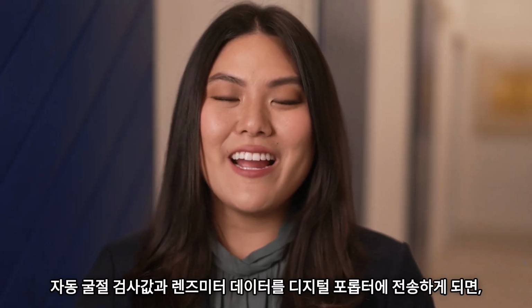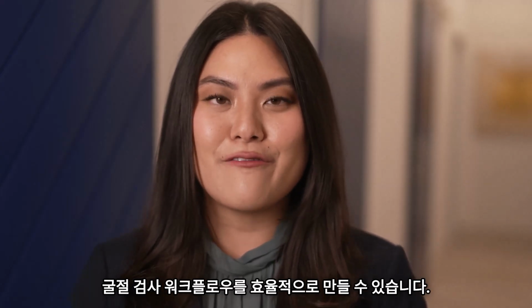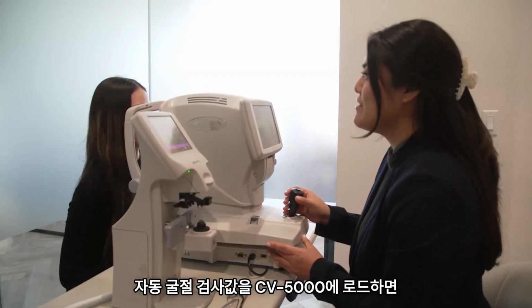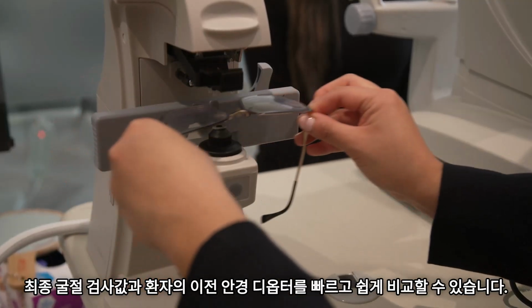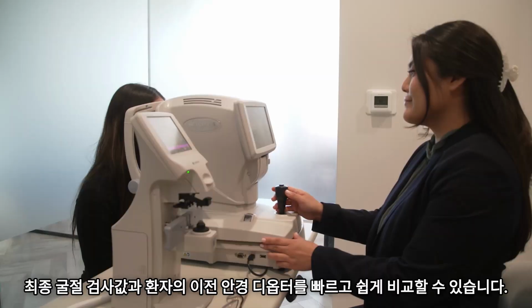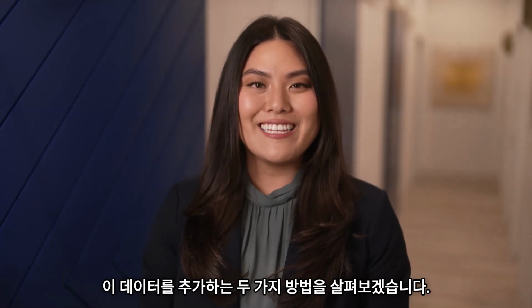Entering autorefractor and Lensmeter data into your digital phoropter is really beneficial for your refraction workflow. Loading autorefractor data into the CV5000 gives you a starting point for your subjective refraction, whereas loading Lensmeter data enables a quick and easy comparison between the final refraction and the patient's previous spectacles. Let's look at the two methods for adding this data.